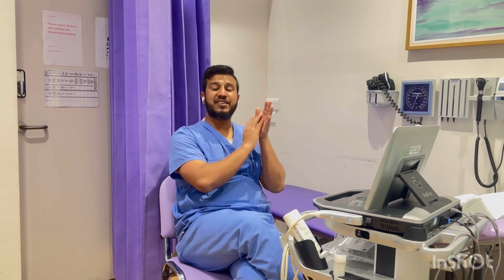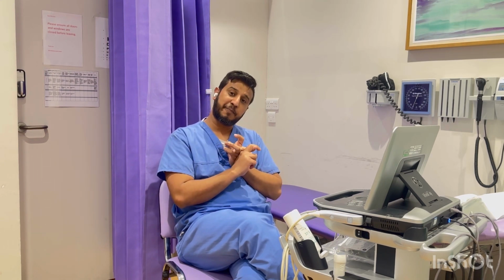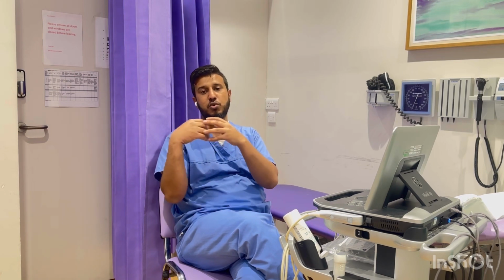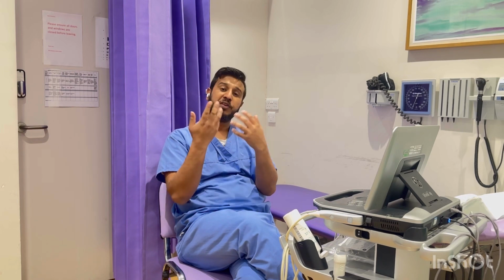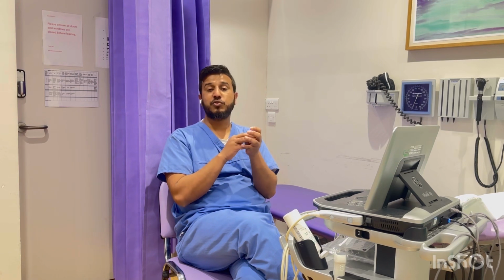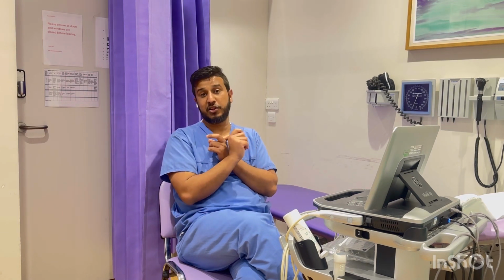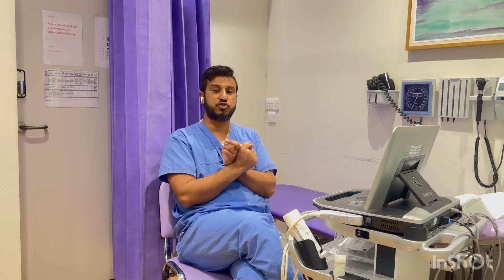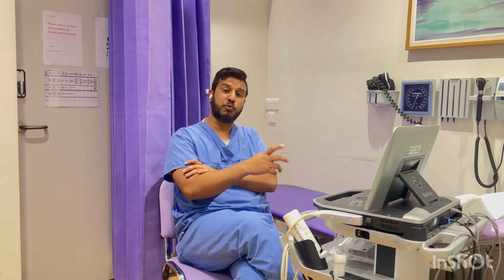Now every window has its subviews as well. For example, in the parasternal window, you are going to get the left parasternal window, and in some cases you also need to get a right parasternal window. I'll explain when, how and why you are going to get it. Once we talk about the parasternal images, it means the left sided parasternal images. Parasternal images also have subviews, for example, parasternal long axis and parasternal short axis images. It all depends upon your angle and the direction of the probe's marker.